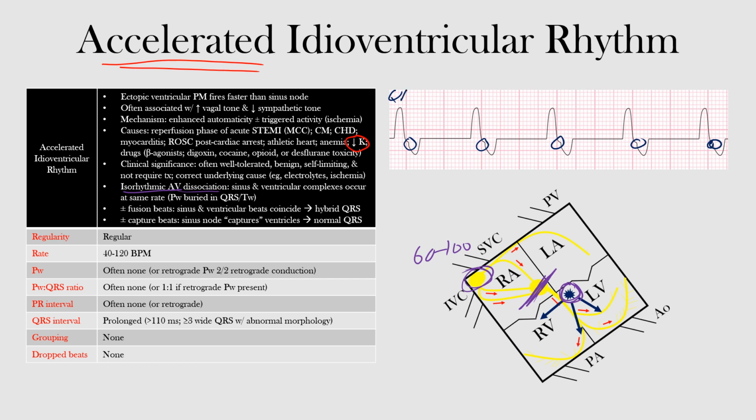And we also have our QRS. So we have ventricular depolarization represented by our QRS complexes throughout, and then we also have these small P waves that are occurring within our QRS complex at the same point. Okay, we call that isorhythmic AV dissociation. So just something a little more advanced, but something I think you can handle.